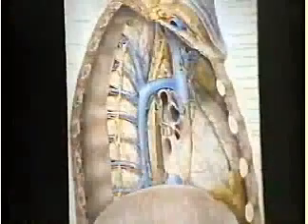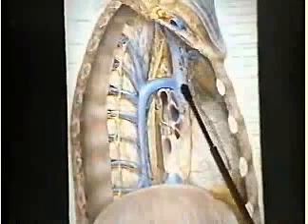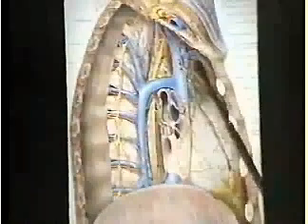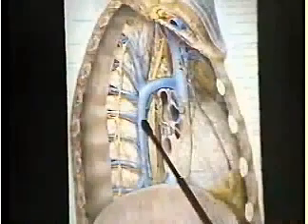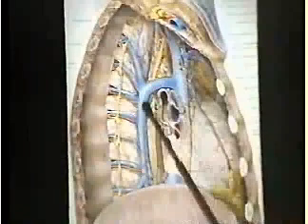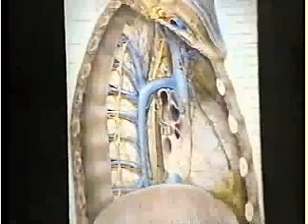Let's turn back to the right side of the mediastinum for a moment. Take another peek at the azygous vein and the azygoesophageal recess. Here on this diagram, the azygous vein is laid out for us very beautifully. Here's the superior vena cava, and coming into its dorsal aspect, the azygous vein. The azygous, of course, has come up from below, though sometimes we speak of it as going down or going posteriorly, but in fact it's coming anteriorly from its proper course.